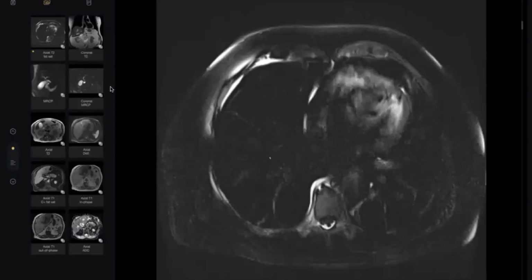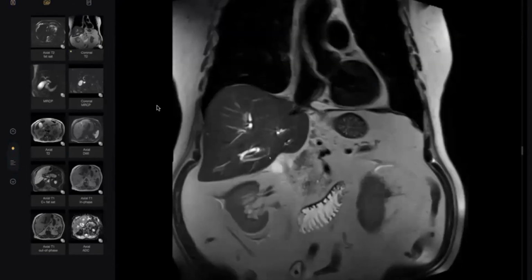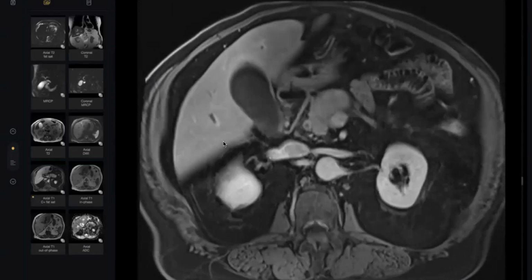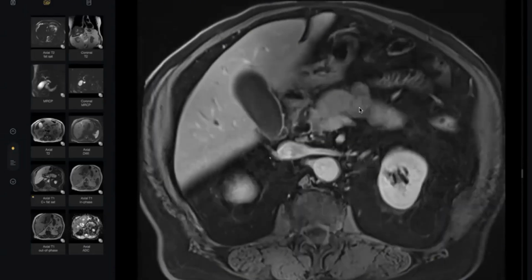See, my colleagues, what I just said is advice for today. This is, I think, the third time. When you see a very old patient and you have a cross section of the abdomen, in my opinion, first of all look at the pancreas. Why? Because this size is not acceptable for this age. Very large.